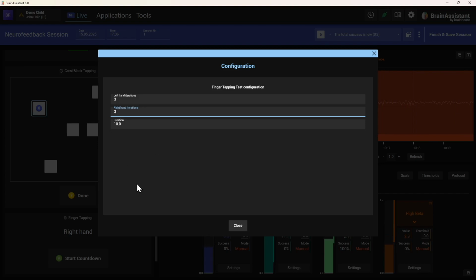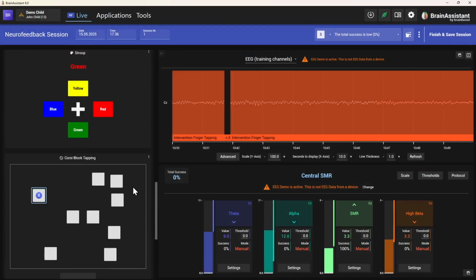So maybe if you have people with motorical problems, maybe you can say, you know what, we just do 1 with your left hand and 1 with your right hand, but I give you 30 seconds, so maybe they're a little slower, or maybe they hurt their hand and they just want to try a little bit, see the opposite, left to right. So here you can also play around a little bit. It's a pretty cool test for also motorical skill set. You can easily perform this before a session. It's not too long. So much about the tests that you can change them.